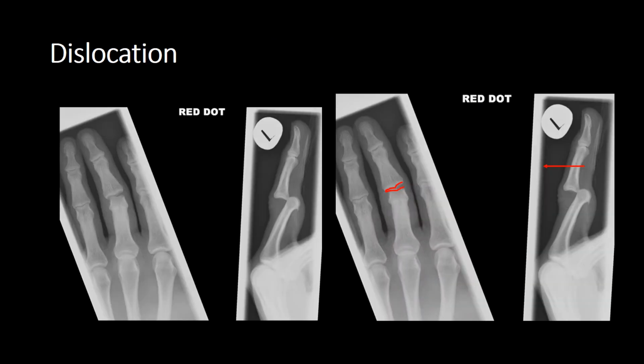I love these radiographs. These are such a good example of why it's so important to do more than just one view. Let's start off with our DP view. Let's look at the interphalangeal joints of the index and ring fingers, and you can quite clearly see that they're very uniform. The joint space is equal all the way across, and you can see that there's no overlap at all.